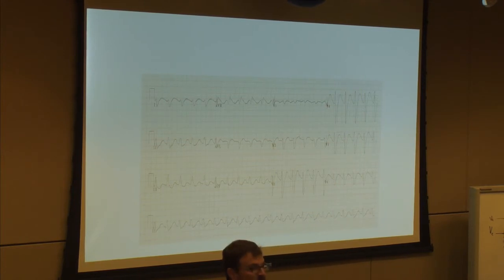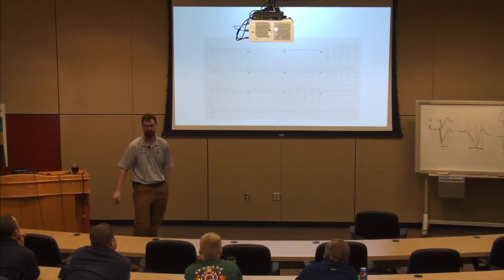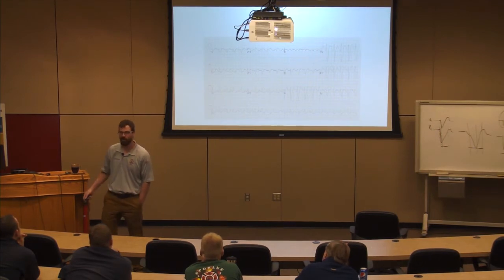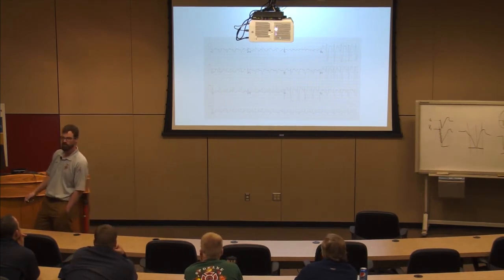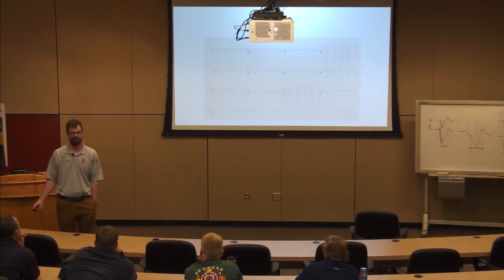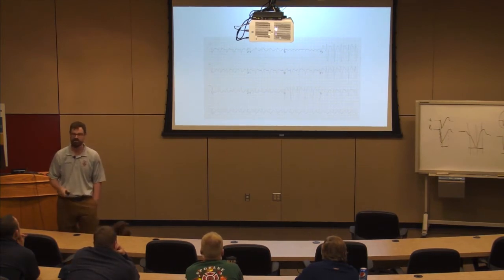In the setting of overdose, I see this. I have a wide complex tachycardia that is, 300, 150, 100, about 120, 115 beats per minute. You could look at this and say, maybe that's VTAC, slow VTAC. Well, VTAC doesn't really go 110, 115, 120 beats a minute. Slow VTAC is like 160. So if I see slow VTAC, then I should be thinking, that's bizarre.